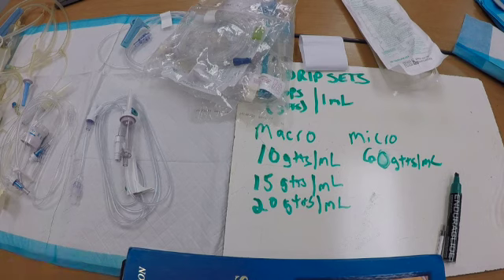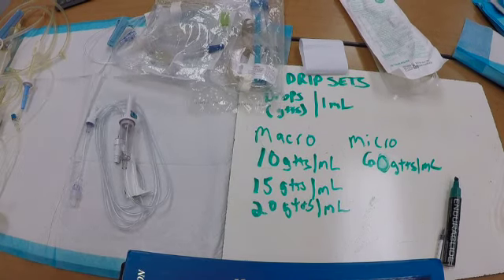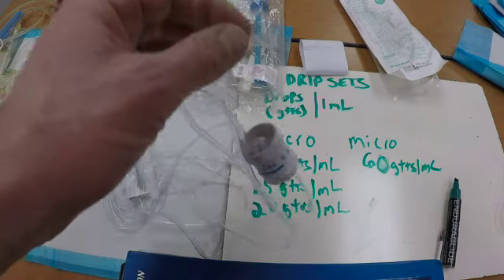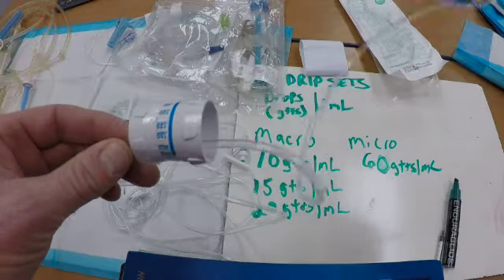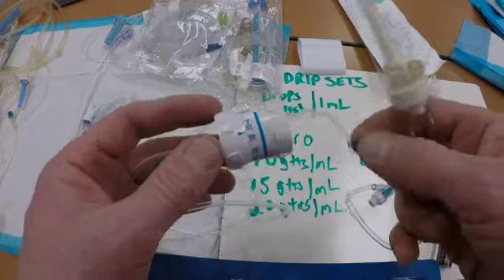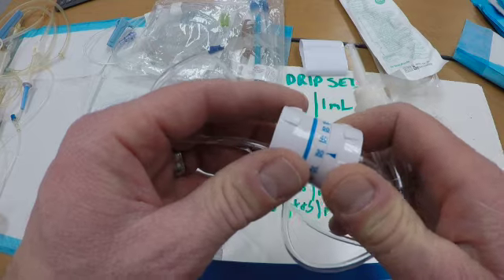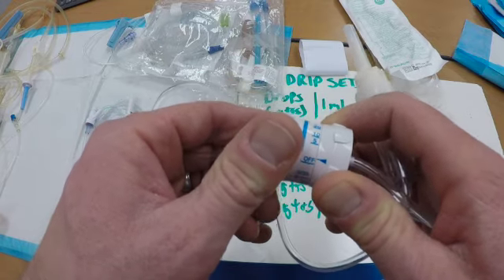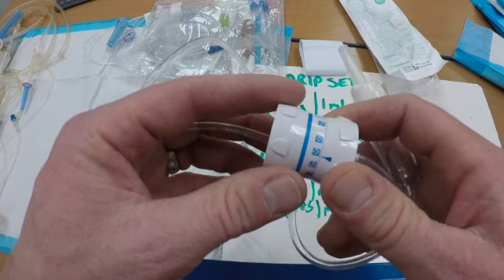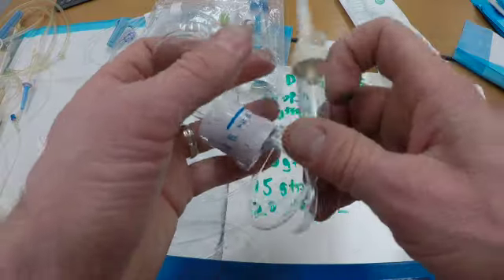Okay, so I just wanted to talk about a few other types of drip sets that we have, and one is a device called the Dial-A-Flow that some agencies near us have used. And the way this works is you spike your IV bag and you set the milliliters per hour that you want it to run. You set your drip calculation and you can adjust this. And rather than counting drips in the drip chamber, you can set this and it will give you the fixed flow rate that you want.